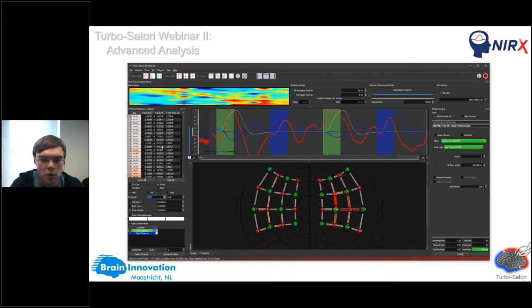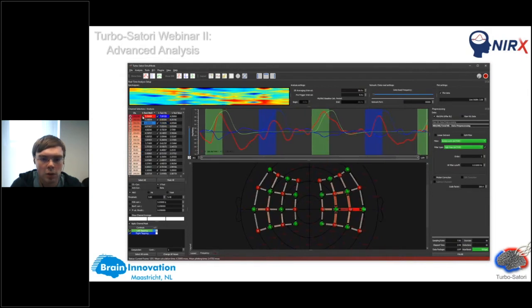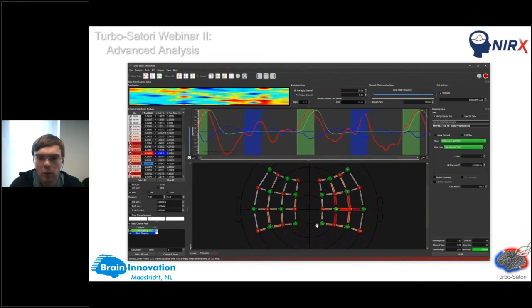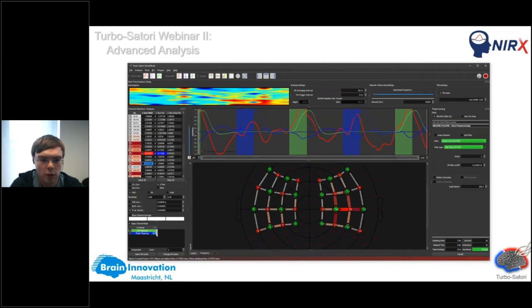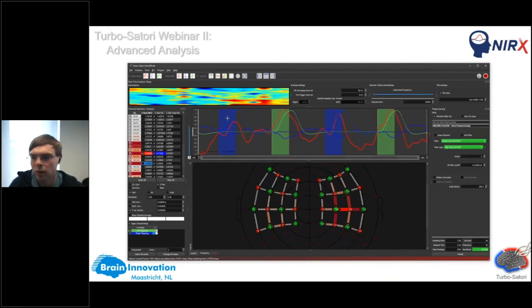Now, if you want to see which one is the strongest channel, you can just use the sorting by double-clicking in this field, and then you would see immediately which channel seems to have the highest t-value, and by double-clicking you can disable this one as well. So this is the main framework for the statistical part. You can also do contrasts, checking if there is any channel which has a higher t-value or a higher amplitude comparing left versus right tapping, and answer specific questions, but this will be covered in a later step.